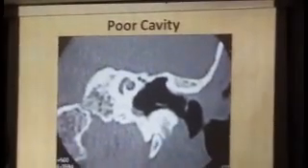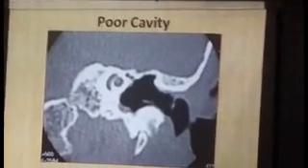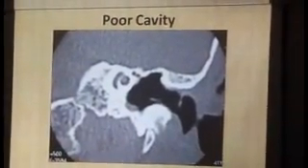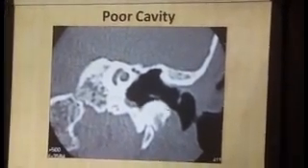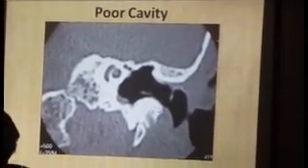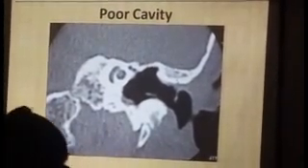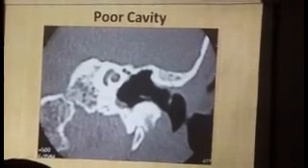What have we been told? That if possible, make sure that the floor of the mesotympanum or the hypotympanum is in continuation with the floor of the external auditory canal when you do a canal wall down. But look at the hypotympanum here and look where the floor is, and there is no important structure here. So if I were doing this surgery, I would flatten this out more. Again, this is giving rise to that funnel effect, which is the root cause of most of the issues as far as a mastoid cavity post-MRM is concerned.